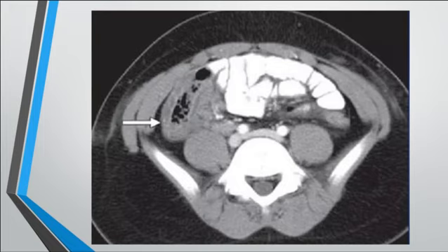And if you look carefully, you can see some edema in the subcutaneous tissue here. In this case, it was a road traffic accident with seat belt injury. So it has nothing to do with bowel wall thickening, just an artifact. You should keep that in mind. Before you say any bowel wall thickening, you need to have a properly distended bowel. If it is not properly distended, it's difficult to judge whether it is real or not. Okay?